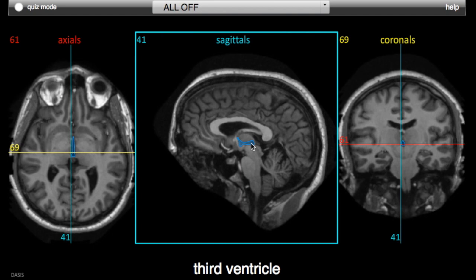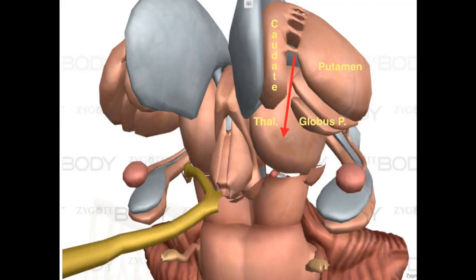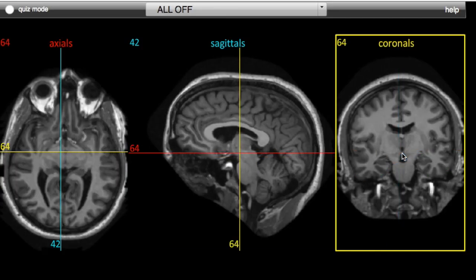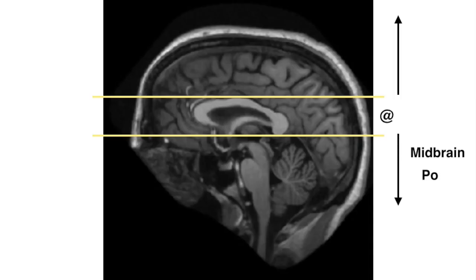We can only see the third ventricle, which is through the thalamus, and the posterior horns, or atria, of the lateral ventricles. In terms of structures, they're still visible and they haven't changed location, with the thalamus and nuclei midline and the lentiform nuclei laterally, with the internal capsule dividing the two. Now below the diencephalon or thalamus is the mesencephalon, or midbrain. The genu and posterior limb of the internal capsule with our motor tracts go on to form the bulk of the cerebral peduncles, aka crus cerebri of the midbrain, which form its ventral surface. So I'm going to move inferiorly until we see the outline of the midbrain with the cerebral peduncles. And this is the start of the next section, the brainstem, which I will cover in a part 2 video.